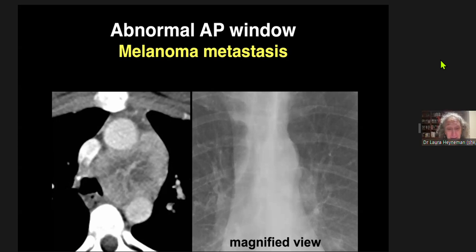If somebody knows a number, please tell me. I'm sure there is one. If you look it up, I'm sure it's on Radiopaedia or something. You can teach me. And as a peds rad, I think even with age, how would you tell? With peds rads, so the thymus, and then it involutes.